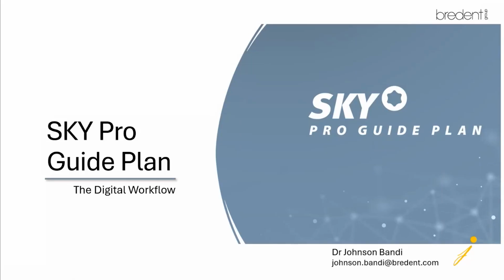Before this, we have done four modules, from implant planning to matching and segmentations, nerve detection, CPR, and also double scan techniques. Today is one of the most important modules, where we will be talking about different varieties of surgical guide designs possible in SkyPro Guide software. I hope you're able to see my screen.